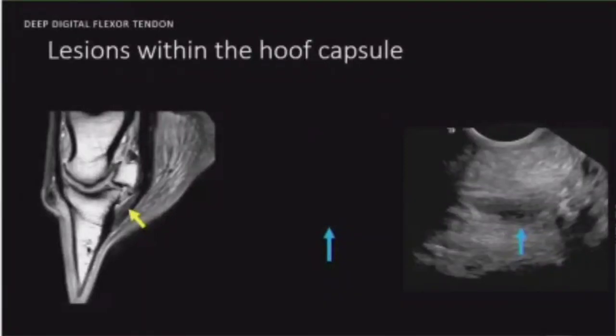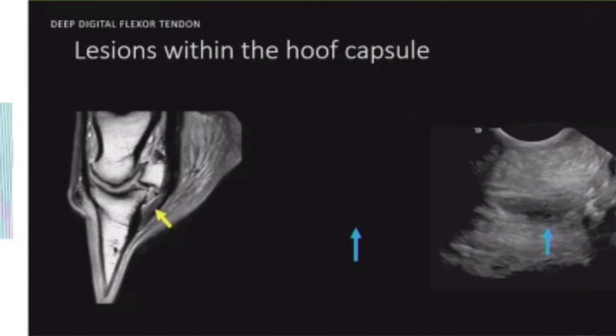Versus MRI. So here we have a transverse. I don't seem to have a... Is there a functional pointer potentially?